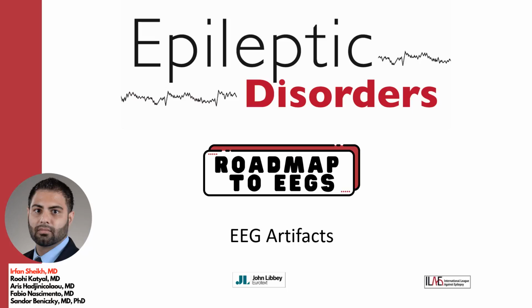Artifacts on EEG are important to recognize, as misinterpretation of otherwise physiologically normal or non-physiologically normal findings may lead to overcalling, overreading of an EEG. Here we will talk about some of the most common artifacts that you may encounter in your daily reads. Briefly, physiologic sources of artifacts are apparent on every EEG recording and are generated from biological properties of the patient and the many sources within the body.